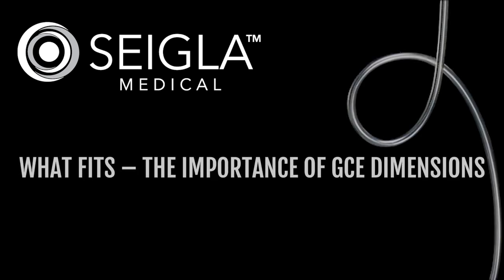What Fits by Seigla Medical. This is an overview of the importance of the dimensions of a guide catheter extension and the influence that those dimensions have on what fits inside them.